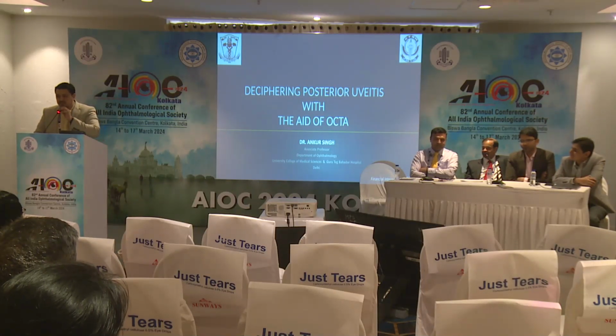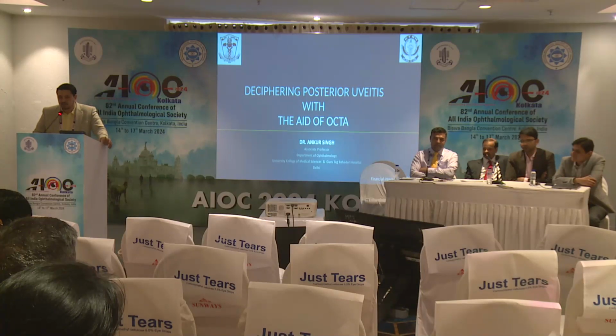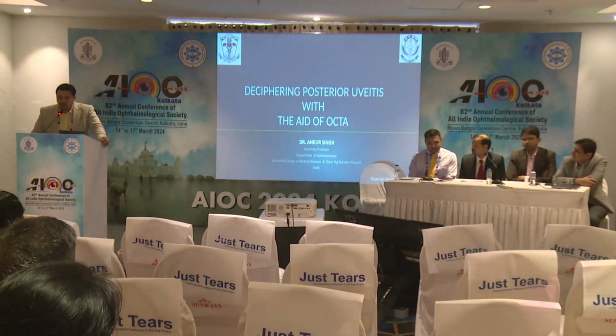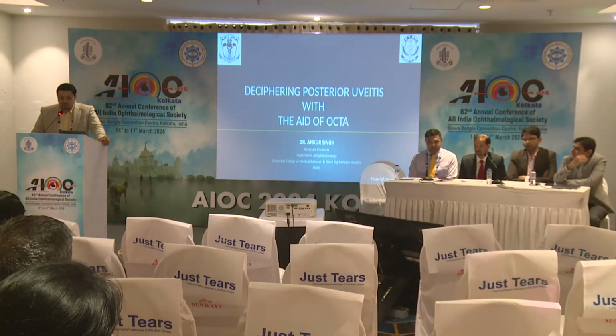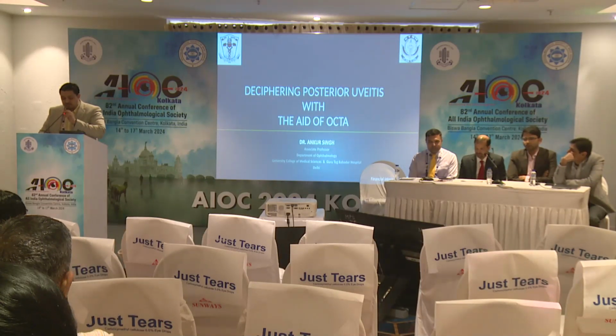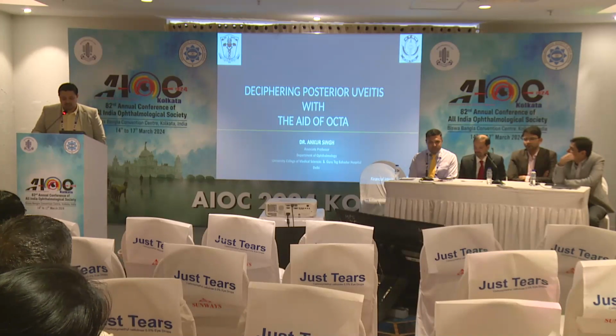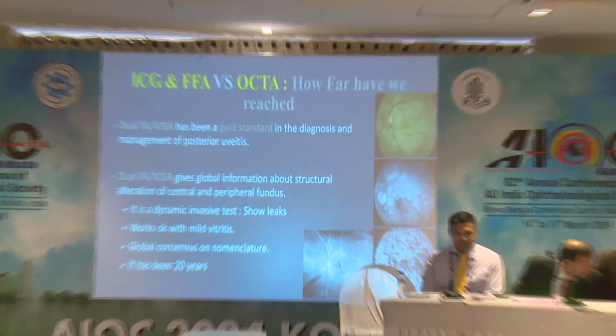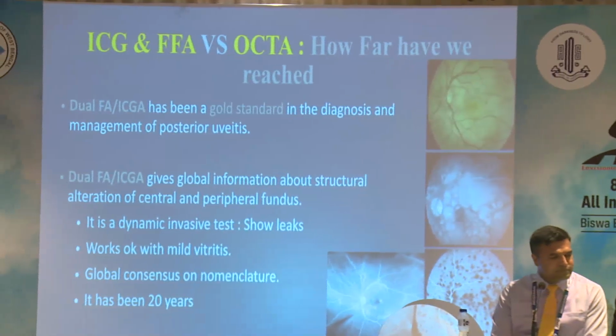So with this last topic of the day, I'm going to digress into the field of ICG and FFA. This field has always been dominated by ICG and FFA, and OCT has had a very questionable role. So let's dive into this field of posterior uveitis with the aid of OCTA. So as we know, ICG and FFA versus OCTA, how far have we reached in posterior uveitis.